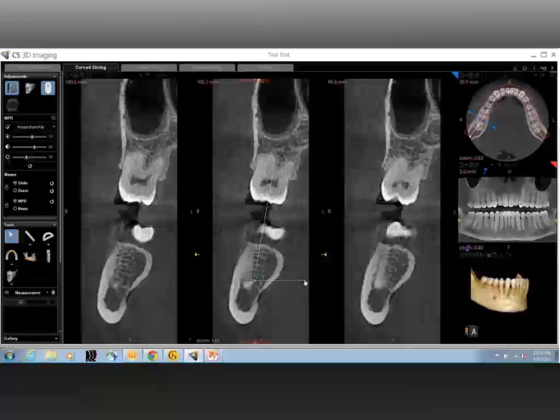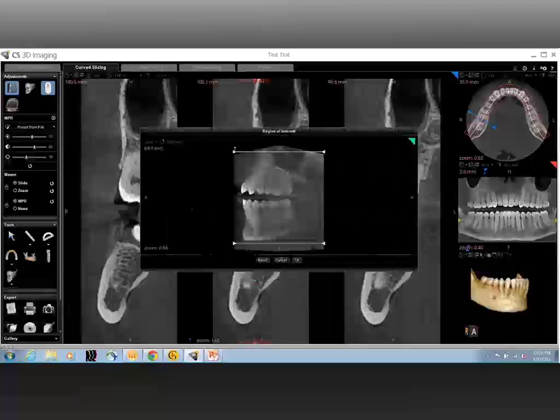Now, how does it help you in terms of implant evaluation? In cases where loading of the implant becomes critical, especially in the posterior area, it is good to identify that angulation of the ridge to change any kind of angulation that is needed in the surgical procedure. Now, once the angulation of the ridge has been analyzed, and I again emphasize it does not necessarily have to be in this order, you also have to critically view the morphology of the ridge.